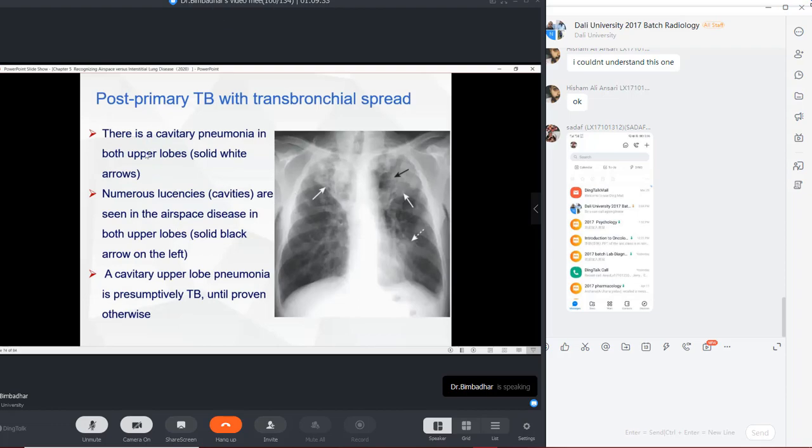And now you see here, eventually the patient will have cavitary pneumonia. All the regions that have been involved with cavitations now come together and form an opacity. And now you see here there is a large opacity with heterogeneous densities in between. Now this indicates it is a cavitary pneumonia, which suggests that it is indeed an interstitial along with airspace pattern.